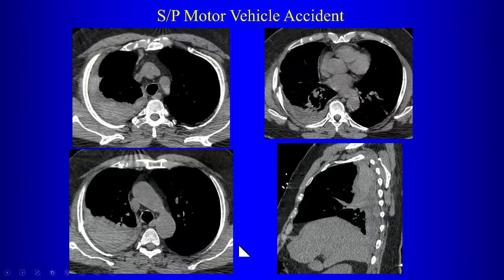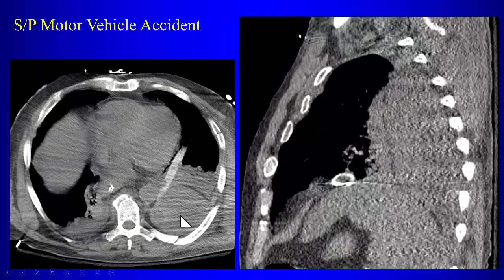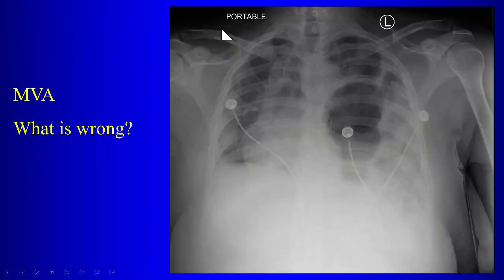Here, this patient has what? Yeah, this is a big hemothorax. Easy to recognize in this case, especially on this non-contrast image, because of the high attenuation. Right? So sometimes you can get a layering effect, a hematocrit effect, but high attenuation pleural fluid is a sign of hemothorax. Okay? So that's another example here of, you saw this earlier, this is extrapleural hematoma. Notice the displaced extrapleural fat. This chest tube will not drain the extrapleural hematoma because that's not in the pleural space.